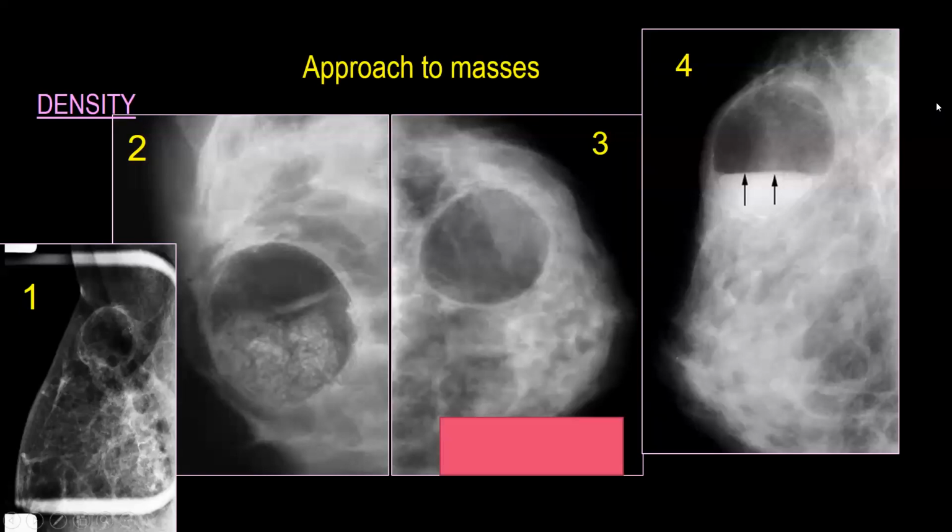For the breast. Sorry, this cyst. Hmm? The same one. Sorry, I came in and out, I am Dr. Rabab. What is this cyst? The one with the fluid level. I'm asking what could it be? Okay. 4 different patients having the same pathology.